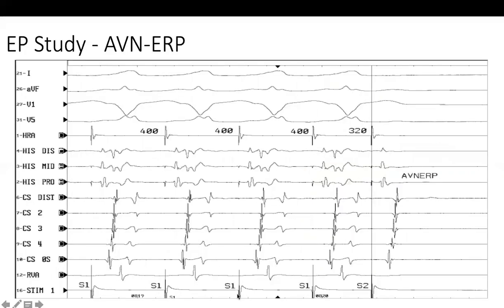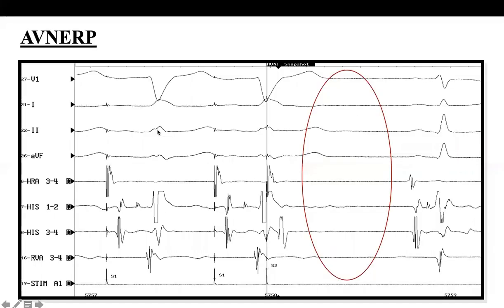Dr. Naif, there is a question by Dr. Naif. Yes. Dr. Ahmed, peace be upon you. And upon you peace and God's mercy. Welcome, may God give you strength. Welcome. Can we call this undersensing? I mean, the device did not sense the ventricular beat, and it happened during the absolute refractory period.